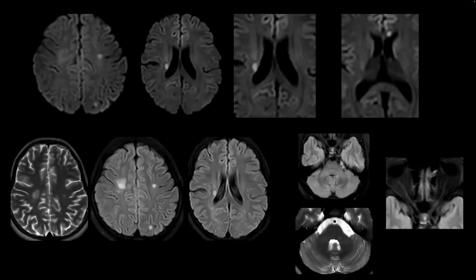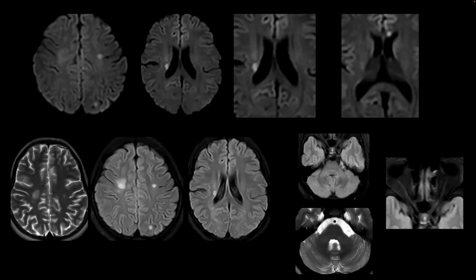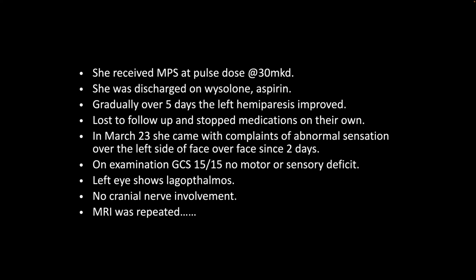So this is the MR? Yes, sir. Okay. So on the follow-up MR, you can appreciate again new lesions. No, sir, this is not the picture, sir. This is the other one. This is in March 23, the one which you are showing right now. So that's the only one I have.